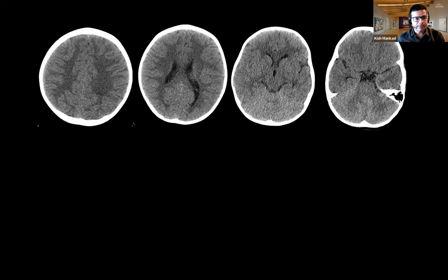So here's a case, and this is a case from some years ago, a sad case. So once again, a plain CT done for headaches, and this was a child that went to 2 hospitals before they eventually came back to our hospital. What is going on here? And I can tell you this child is 4 years of age, not very different from the previous age group that we just saw. So back to you for questioning.